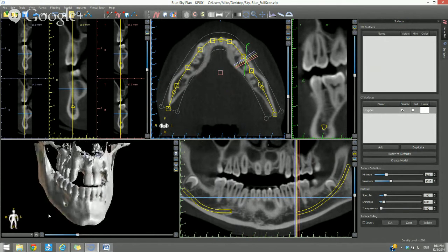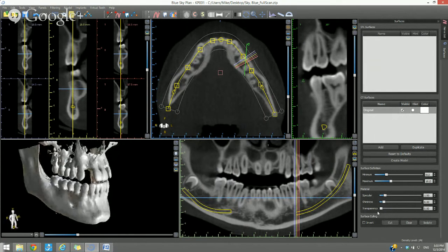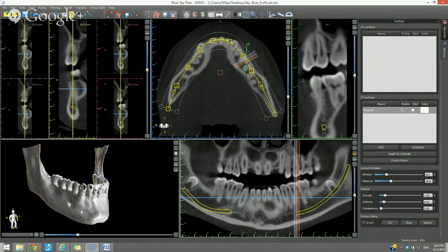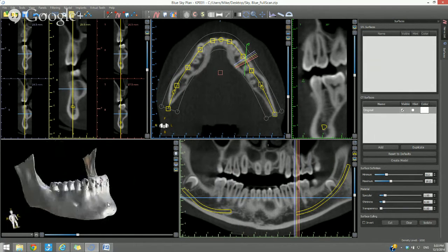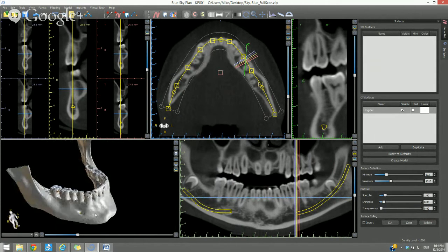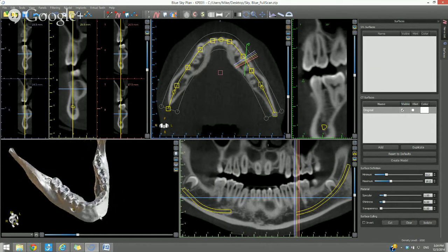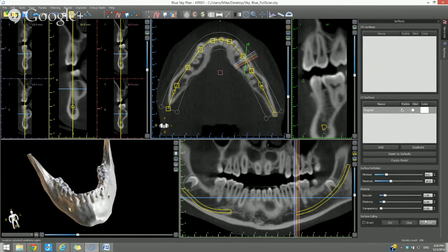A couple of other cool functionalities that we have here from the surfaces panel is the isolate button. The isolate button, I think, is really helpful. We have it right down here. And when you click the isolate button, you can then click on the surface of what you want to keep, and everything else disappears. Okay, anything not connected to that surface has disappeared. So if we're dealing with the mandible, we have just cleaned it up. If we're merging a scan, then it gives us a good field of view to do the merge. So the isolate button, I think, is a good functionality.